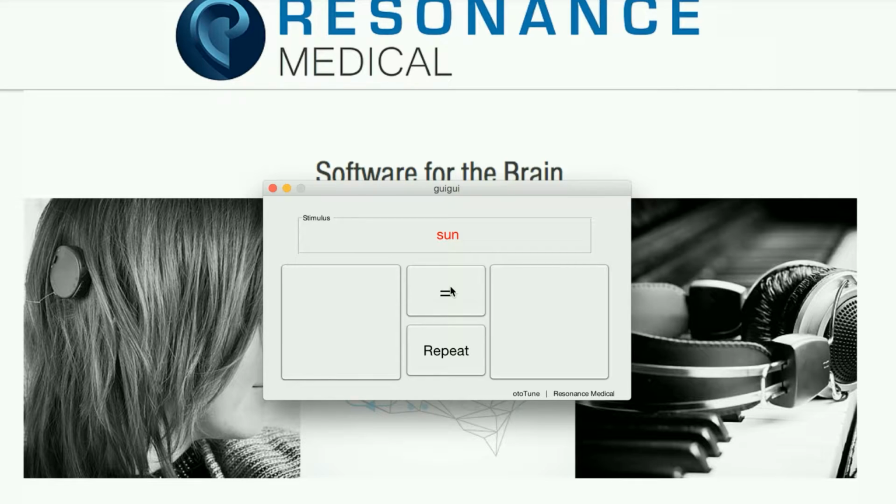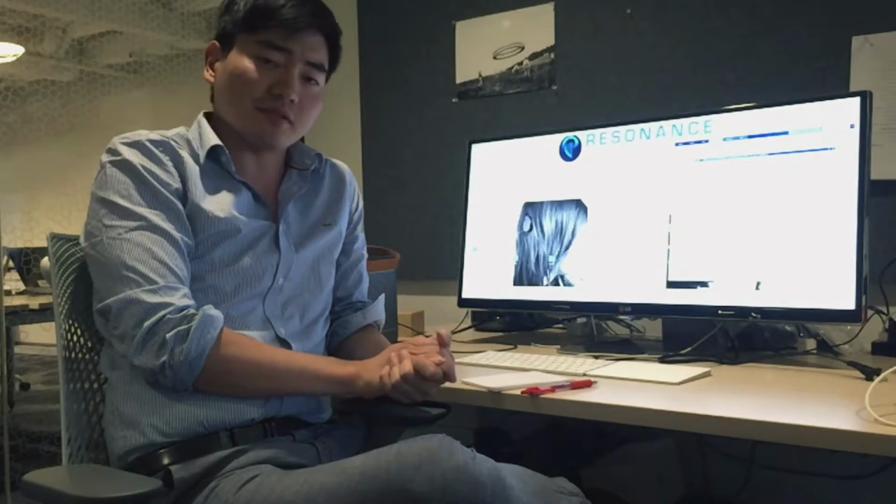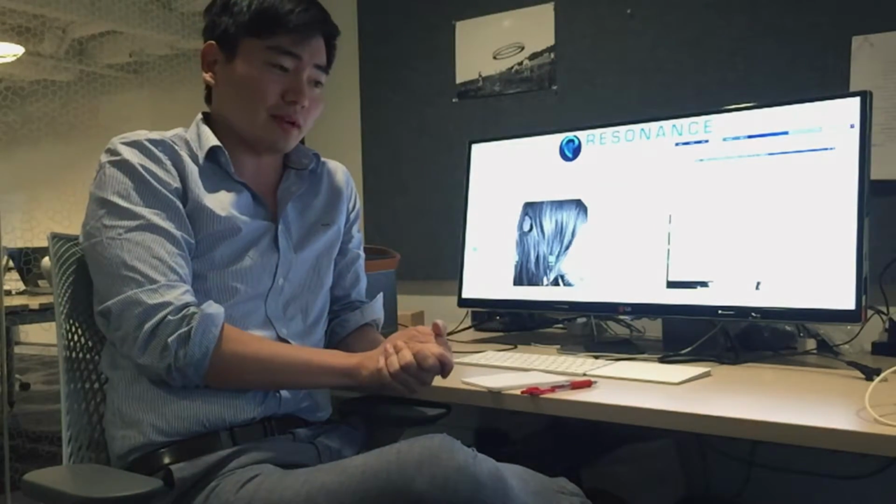In fact, a subject can go through a few hundred of these in 20 to 30 minutes, which is sort of the time frame we're looking for to perform the optimization. In our testing, this has done quite well in suggesting parameters that sound optimal. So those are the three main optimization strategies we've been taking to tackle this problem.